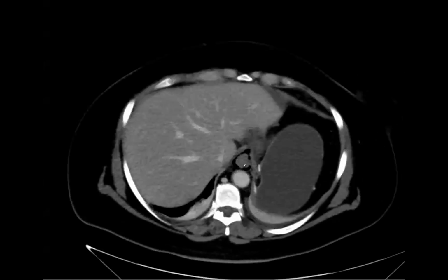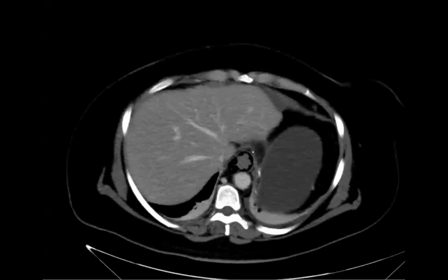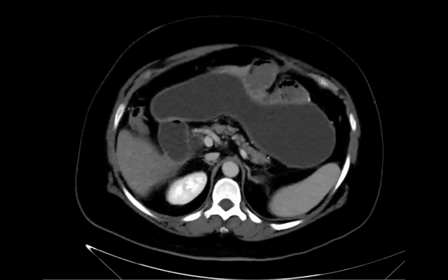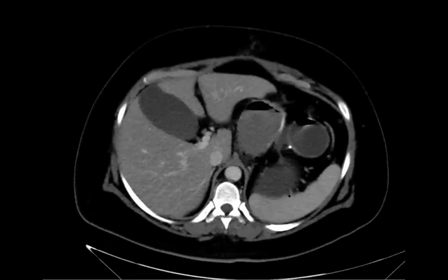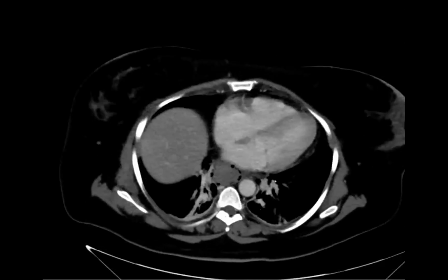Victoria, why is it that we don't normally see pneumatosis of the esophagus? I don't know. I guess the ischemia. I honestly don't know. I was thinking about that. Is the ischemia less likely? I don't know. Have you seen it? For me, this is the first time. No, I've never seen it. It basically perforates before it becomes ischemic, for some reason.